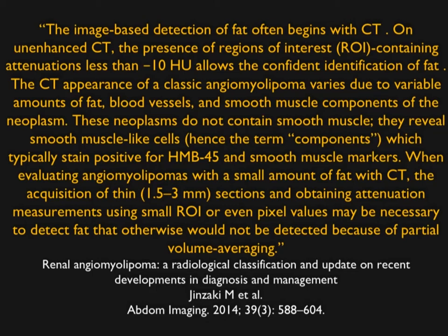And you could ask, is it possible to see fat in a tumor that's not an AML? Reports of renal cell carcinoma or occasionally Wilms tumors with fat have been noted, but invariably those are very large aggressive tumors which invade the perirenal fat, and it's not so much fat in the tumor as fat in continuity with the tumor.